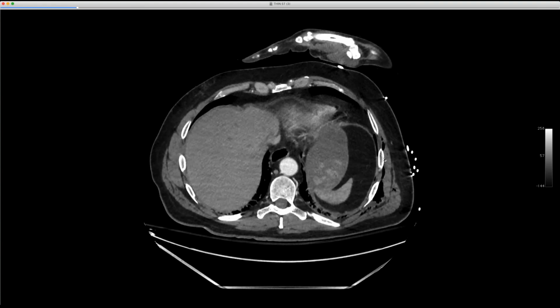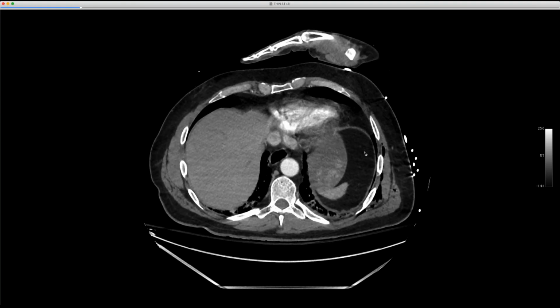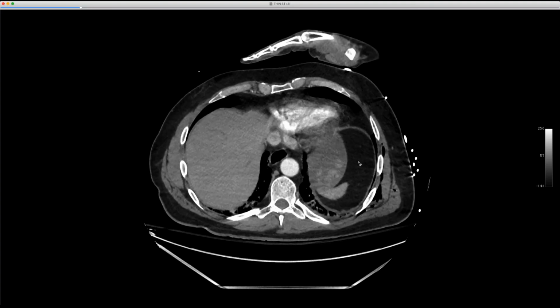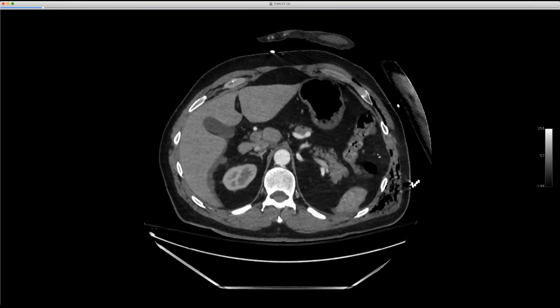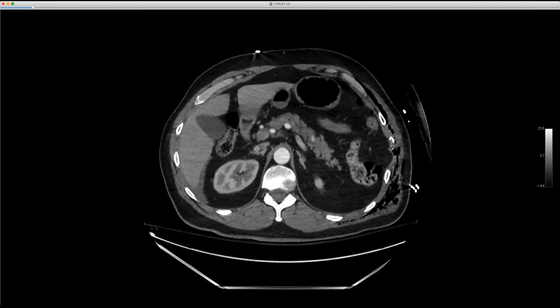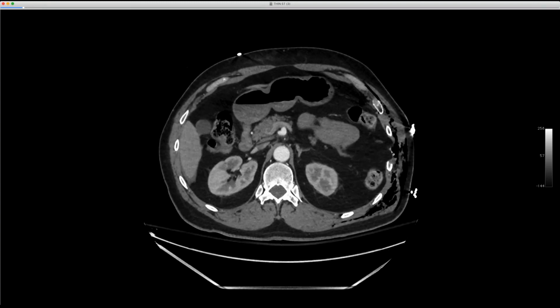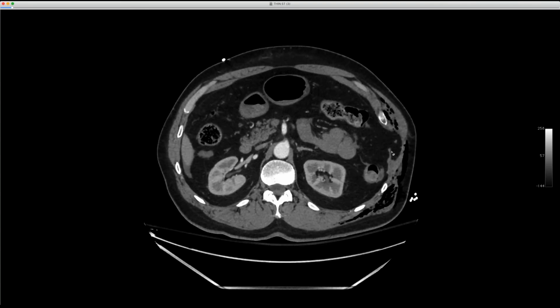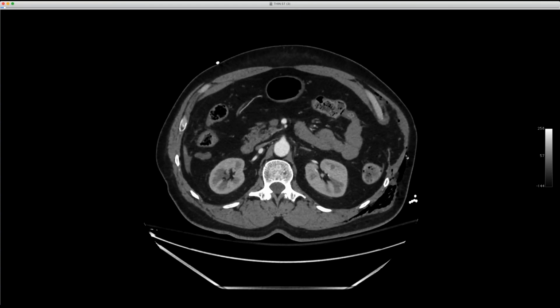So I wonder if it was just the position. They ended up doing a splenectomy because there was bleeding at the time of the surgery. You see the diaphragm is elevated, but up at the dome, it's pretty intact. We don't see any herniation there. So I think this is a low-lying lateral diaphragmatic defect, and we just catch a portion of it on the chest CT. It was presumably torn from a combination of rib fractures and blunt trauma. A little bit of an unusual location for a diaphragmatic defect. I wish they took some pictures intraoperatively. He had some bleeding in the mesentery as well, but it formed this hernia between the ribs out here.